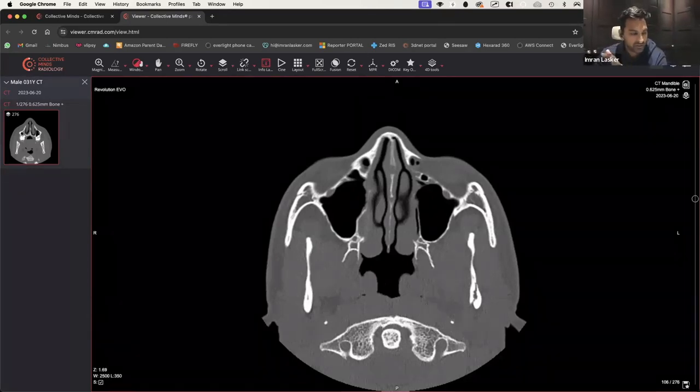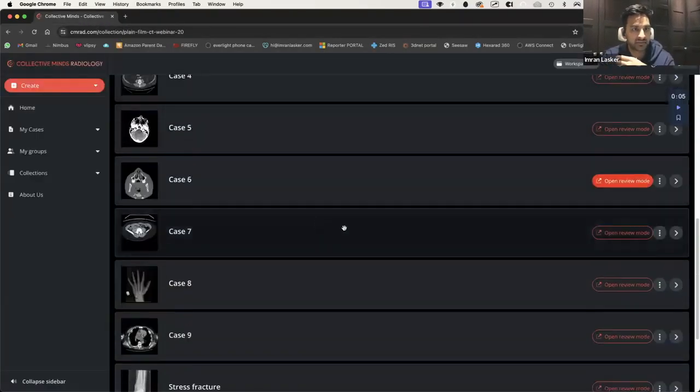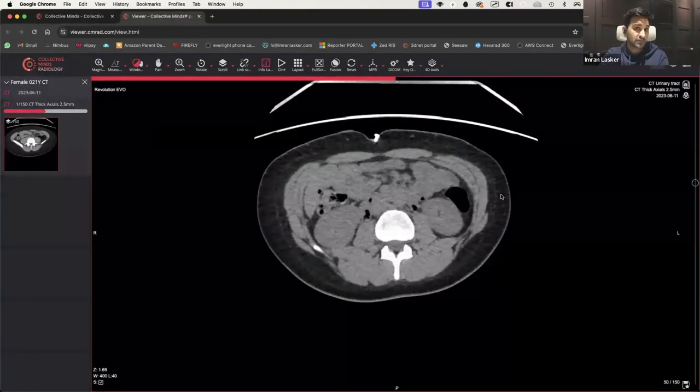Yeah, so the 3D reconstruction, you are right, but I have found on occasion you do miss subtle ones because it has this tendency of slightly smoothing over. So if it's a really small fracture, it does slightly smooth it over, and it does a weird coloration thing where, well, the ones I've done, and you may want to correct me, the 3D reconstructions that I've seen make it look a weird creamy color, and it's actually just easier to have black and white. And I found over the years that doing that MIP method has been a really good way to make sure that I don't miss the fractures too much. Right, cool. But anyway, if it works for you, it works for you. It's just a different method, and sometimes it may be worth trying all and seeing what works.